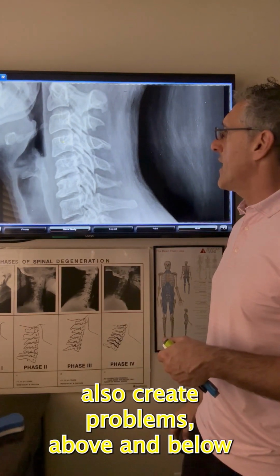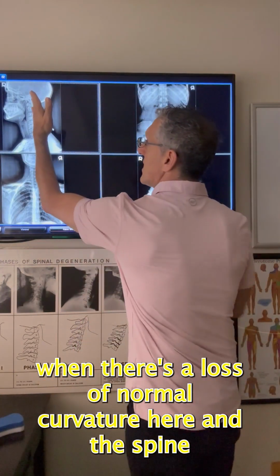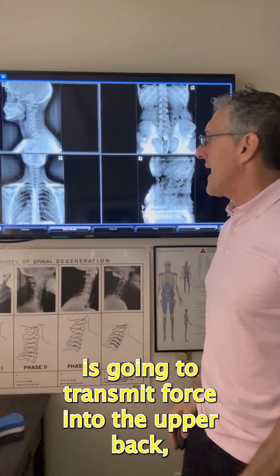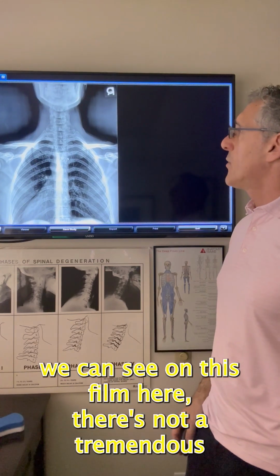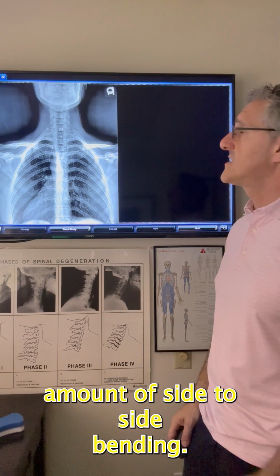This will then also create problems above and below. When there's a loss of normal curvature here, the spine is then going to transmit force into the upper back, and where any sort of a misalignment might exist, we can see on this film here, there's not a tremendous amount of side-to-side bending.